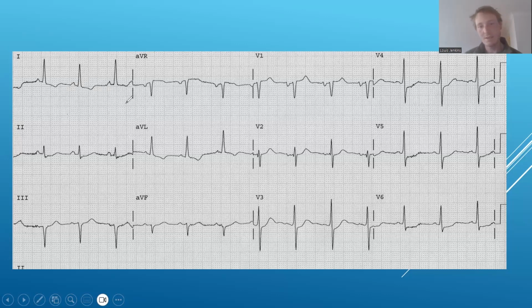So looking broadly at the ECG, something a little unusual is that we have these changing QRS morphologies here. I'm curious about it, but I don't ultimately think it means anything in the context of this patient because it's not really repeated. It might just be an ectopic atrial beat that's conducting slightly differently. Sometimes you can see a pattern where every second beat has a different morphology, but it won't be bigeminy. It will still have a normal sinus atrial P wave before it.